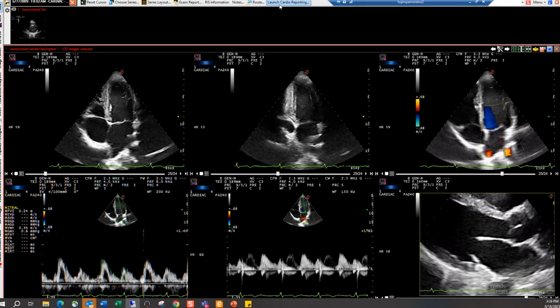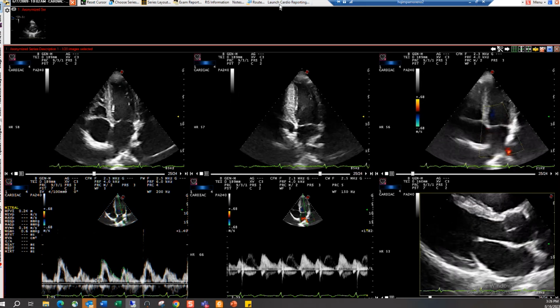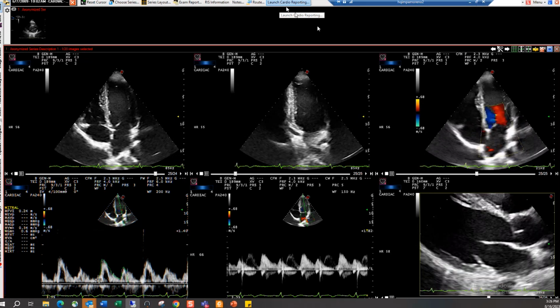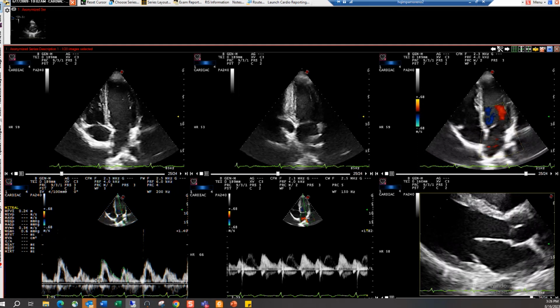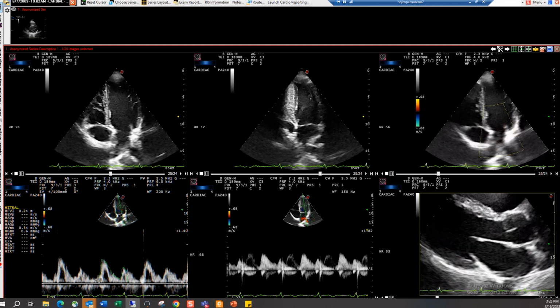So Dr. Scott, do you want me to log in here, or do you want to share from somewhere else? Yeah, I'll just share from my screen, but the concept is the same. You click the launch reporting button, and then it would come to me. Okay. So that's what that button will do. So, okay, if I can take control.